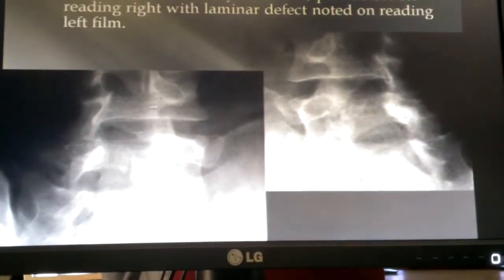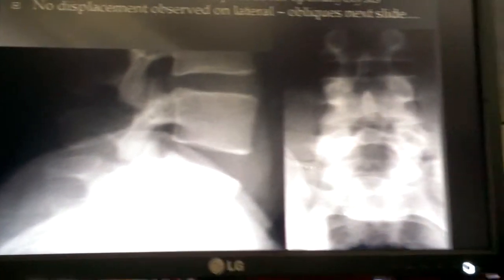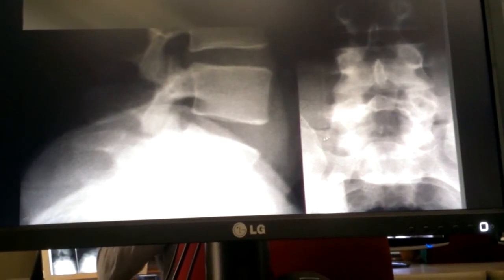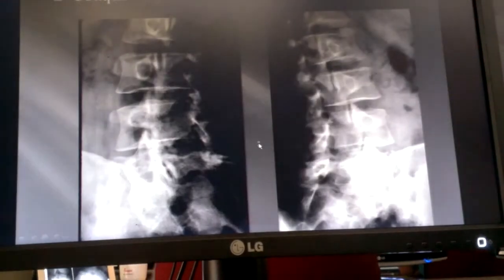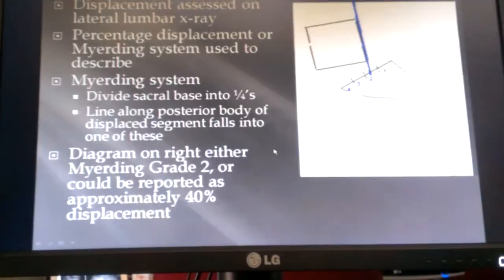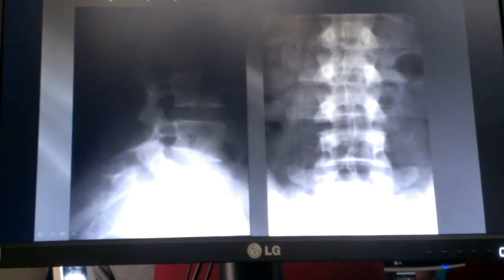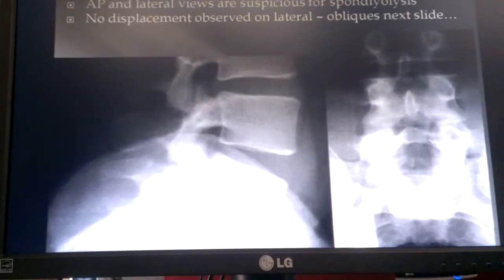Let's see if I've got something to show you. Not so good here. But here's the transverse process. Eventually, with the slippage forward, the transverses will overlap the ala of the sacrum. Okay, so these will start overlapping with the ala here, the more it slips forward, that's all.